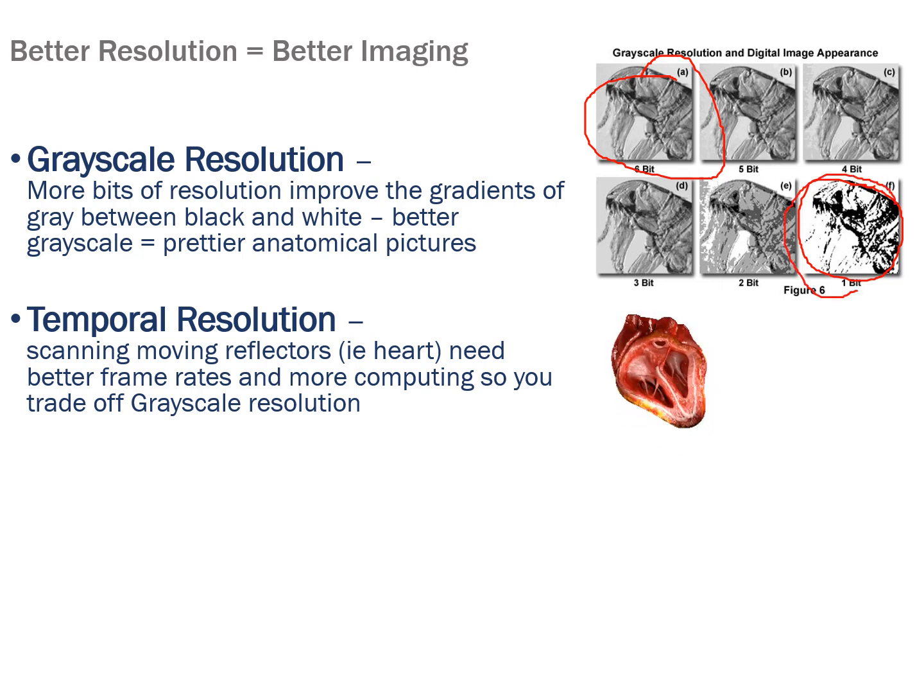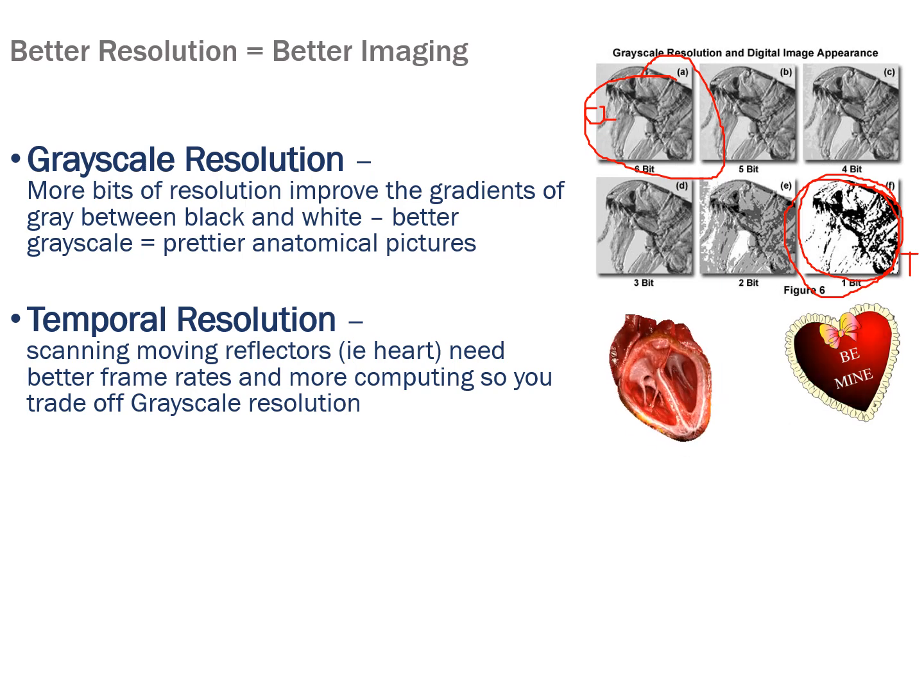This would be more like a phased array probe where it has lower qualities and more black and whites because it needs to keep temporal resolution, or time of the movement of the specular object. And this would be more like a curvilinear probe here, where it has better grayscale because the objects that it's scanning aren't moving. That temporal resolution is an important component.